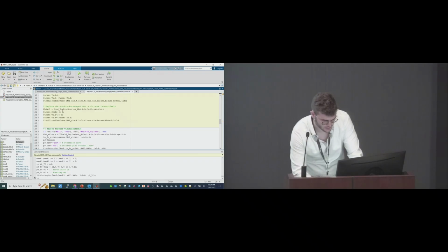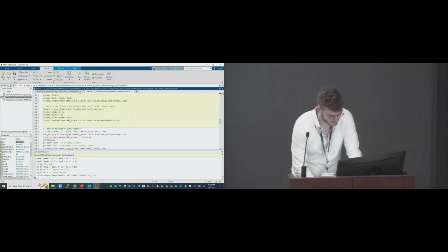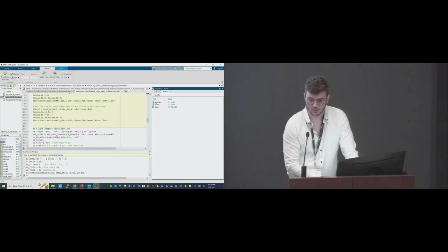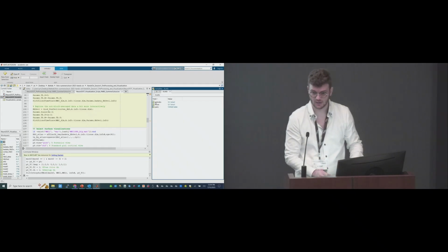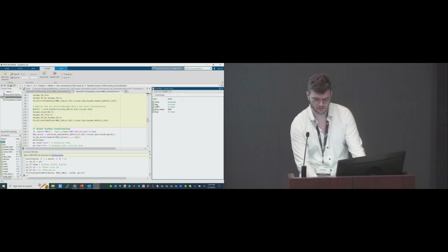So right here, inside our info.tissue.dim, I'll highlight this. You're asking a great question here. The reason we need our A matrix for all of this, we don't need the actual A, we need the metadata, because inside this tissue structure for the A matrix, that gives us a lot of our anatomical information from that FreeSurfer or MNI space.